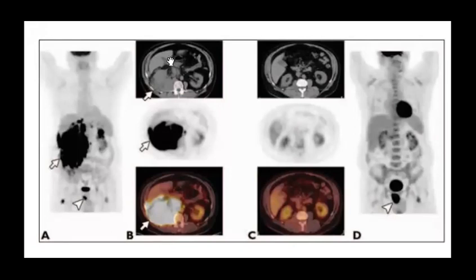So the question here is, is it 2 patients or 1 patient? This is 1 patient. So what happened? He took what? So which one is the baseline? We can ask it as another question: which one is the baseline imaging, and which one is after 2 cycles of chemotherapy? Okay, so this is the same patient, but he took chemotherapy treatment. Which one is the baseline? This one, and this one after.